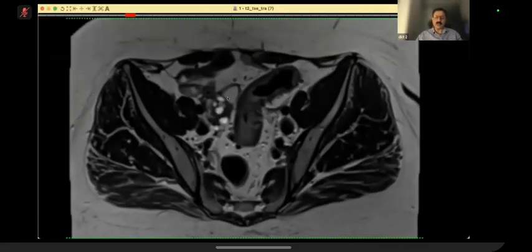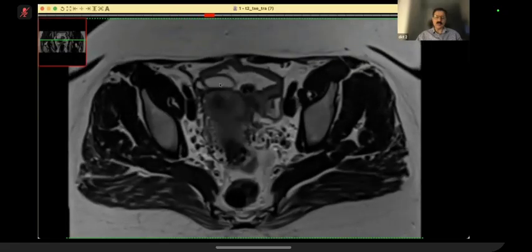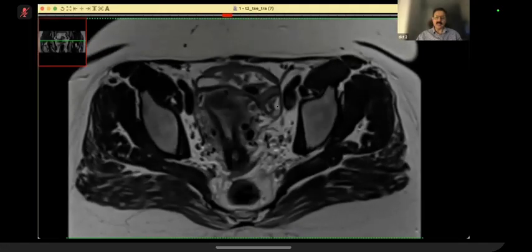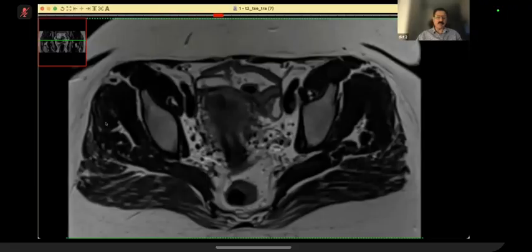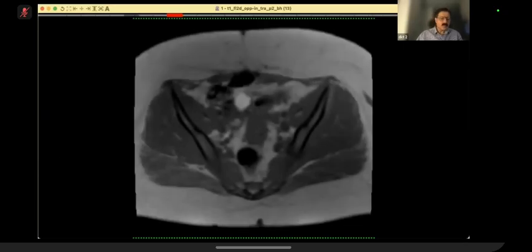With that, look at this structure, which is next to the ovary. And it looks like here you can convince yourself. You see, it becomes a tube shape. This is a dilated fallopian tube. And this structure also is sort of flute shape. Tube shape, I mean to say. And then if we go to coronal, I gave you T2 coronal.